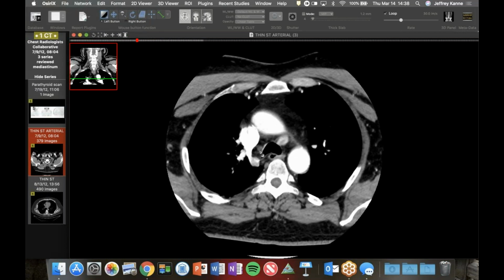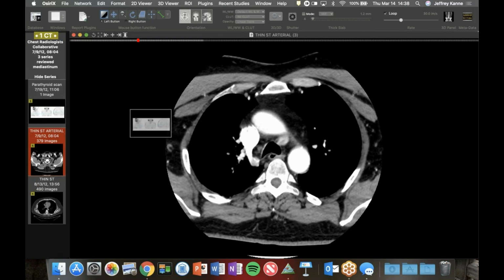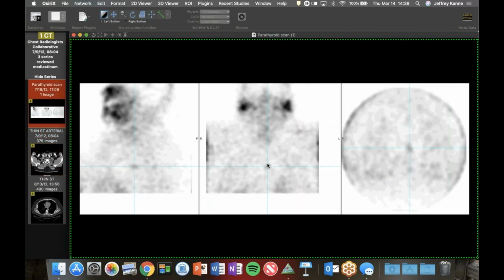This is a neck acquisition, but you can see we're on both the levo phase and the dextro phase of this, so it's not early or late or anything like that. There's just a lot of contrast on board. And I've not seen mediastinal lymph nodes enhance that intensely when they're normal. This patient was being worked up for hyperparathyroidism, and here's the nuclear medicine scan, and you can see there was an area of sestamibi uptake in the mediastinum.